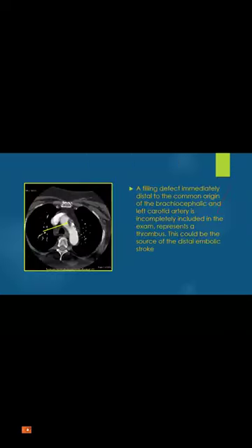Here, this case was a stroke, and everything was called patent, but small emboli were not seen on the angiogram. The only thing is the source. This was missed because we have a tendency not to look at the arch, or say what we see in the arch, when we do CT angiogram. So this is a thrombus in the arch of the aorta, which is the source of the emboli or thrombi.